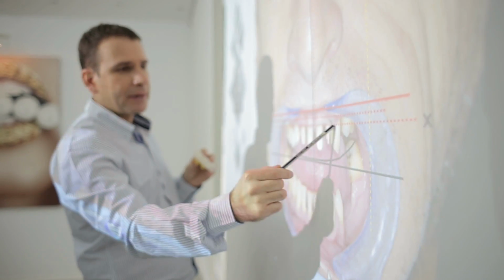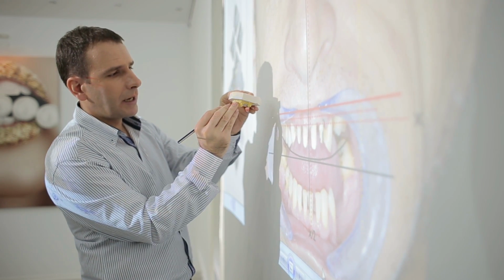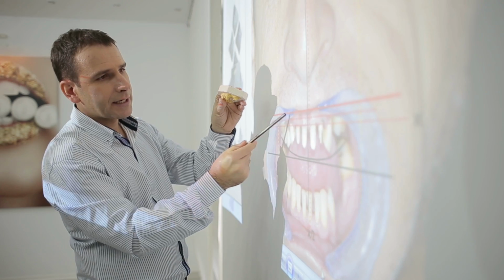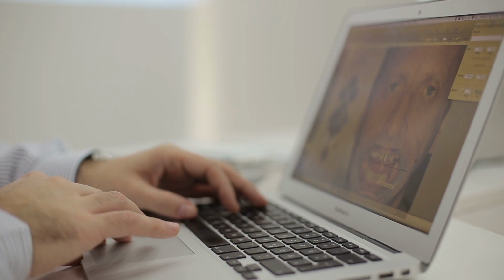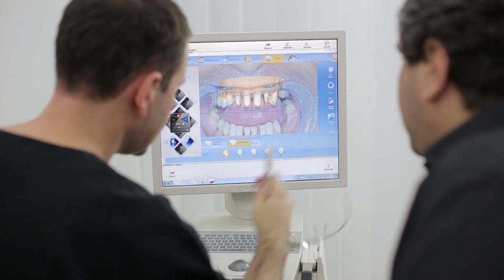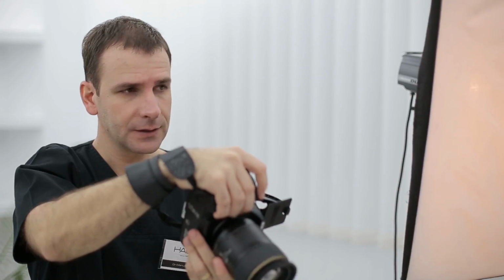The Pro version can quickly and easily identify and determine the facial axes and the incisal edge by automatically analyzing a portrait photo of the patient. Later on, these lines are calibrated on a 3D dental model, offering better guidance during the design of the teeth by using all the facial information.